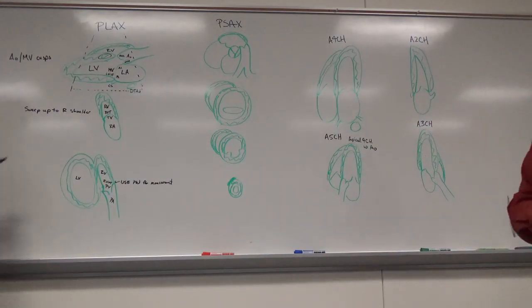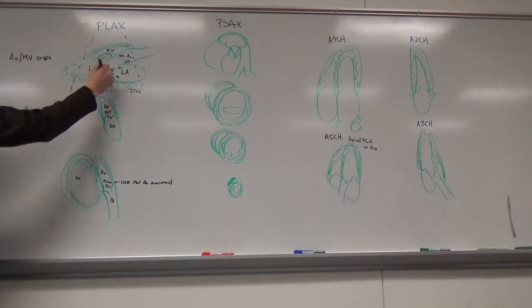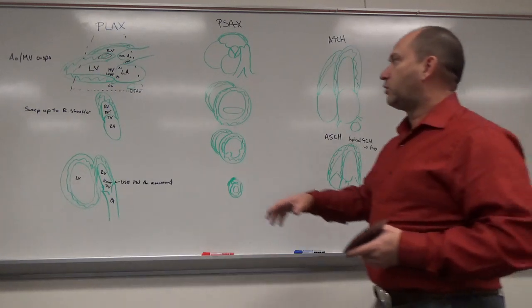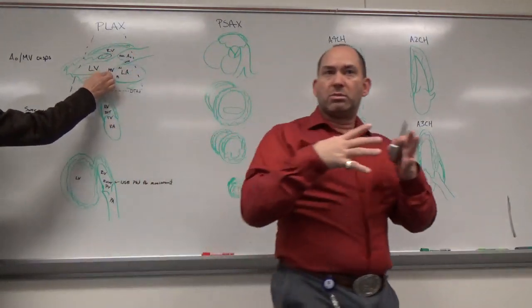In the slides that we went over online, you'll see that we talk about trabeculations and pectinate muscle and stuff like that. Those are kind of muscly ridges. In the ventricles down near the apex, there's going to be a lot of trabeculations, and that posterior aspect of the heart, there's a lot of trabeculations. As we get into the outflows here and up here, that muscle becomes smoother.